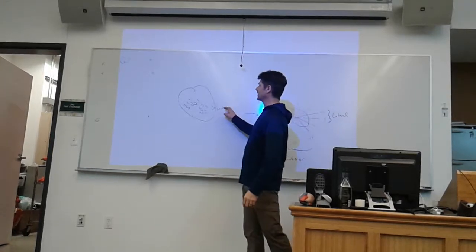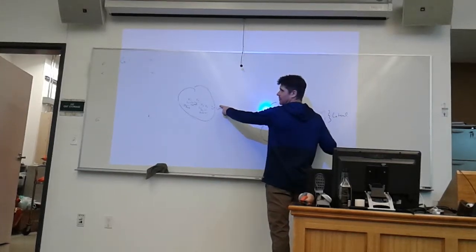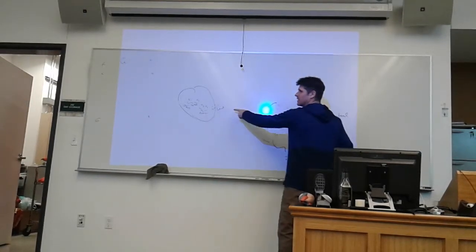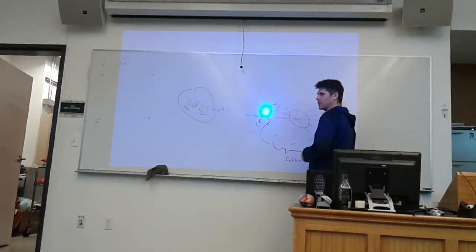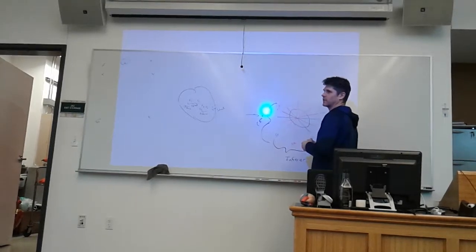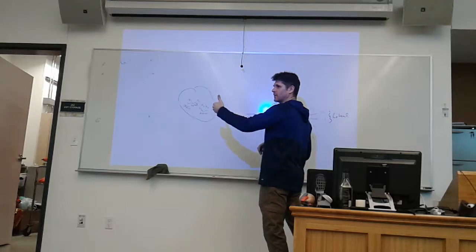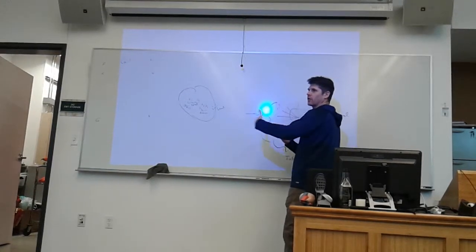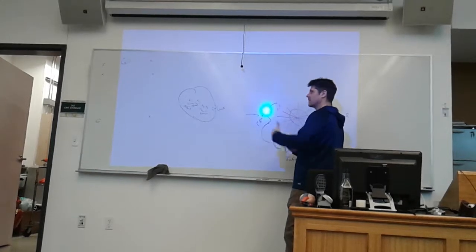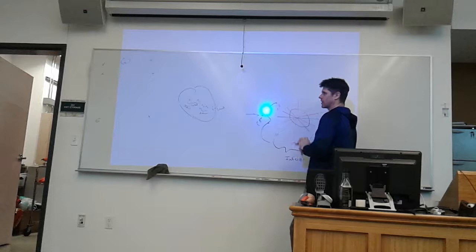Like V6 and lead 1, even though those two are looking at the exact same thing, you do see a little bit of a difference in those two leads. You would expect them to be exactly identical, but they're not because of where that negative is actually found. You get a little bit of crossover of what's happening around that area, but it's not an exact look like what you'd see in a lead that goes all the way through.